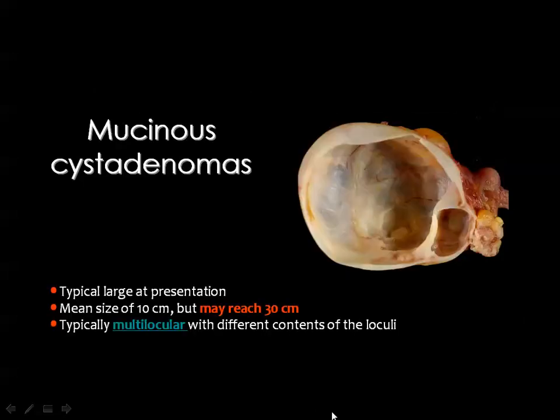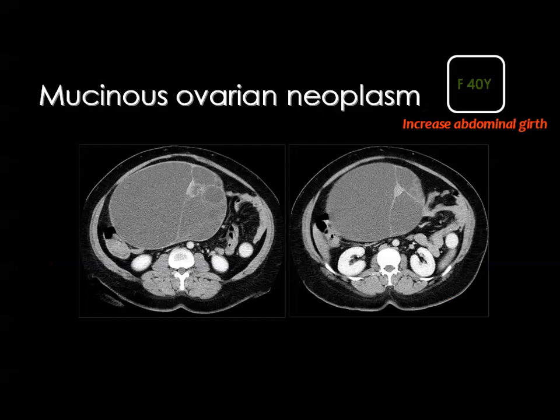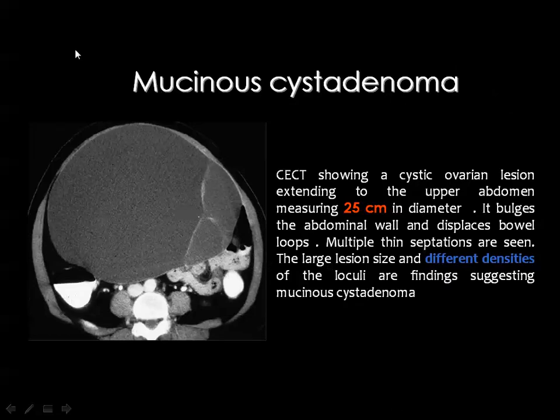Then the mucinous cystadenoma contains septations, and here you get an example. A huge cyst also, and you can see internal septations, but very importantly, you do not see a solid component. Solid component means that you are dealing with a malignant pathology. But only here you can see cystic septations, and you may also see some calcium. And this is a good example of a mucinous cystadenoma, and you can see the septations and you don't see the mural nodules.